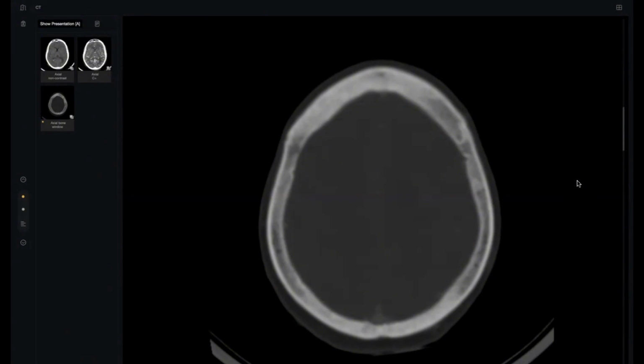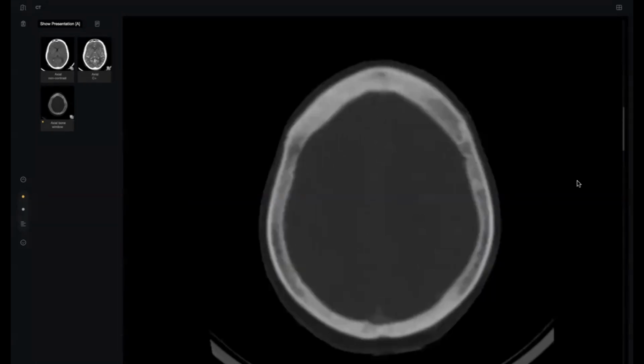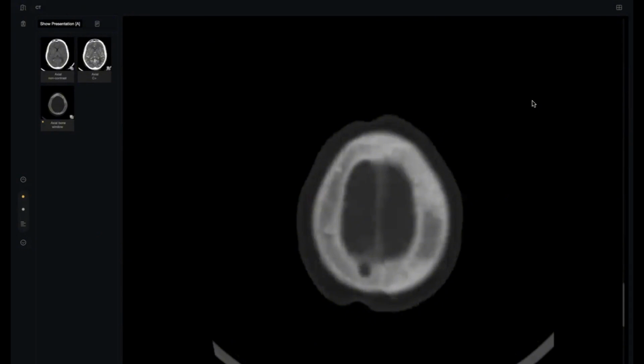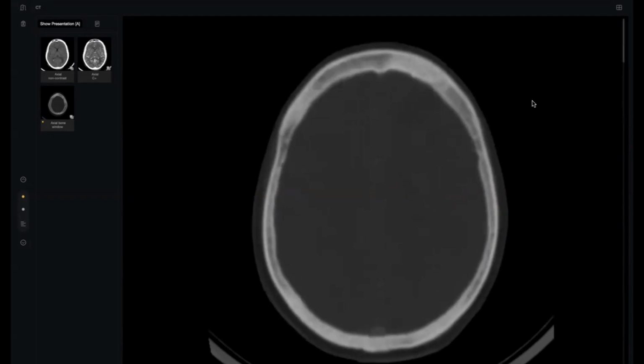Which primary do you think about? Sir, if it's a female patient, it can be breast carcinoma, because of the sclerotic bone mets and also the intracerebral mets. What's your next step? MRI. What else? Search for the primary with a whole CT, post-contrast CT of the chest, abdomen and pelvis to look for any primary. Give me a simple radiological examination.